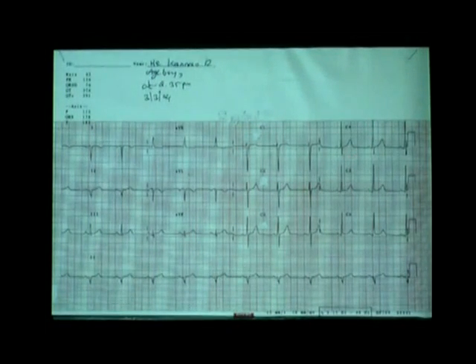That means his left ventricle is on the left side only. So whenever you have a normal progression on the left side with the P wave inverted in L1, it is technician-induced dextrocardia. Whereas whenever the P wave is inverted in L1 and there is non-progression of R wave from V1 to V6, then you are dealing with true dextrocardia.